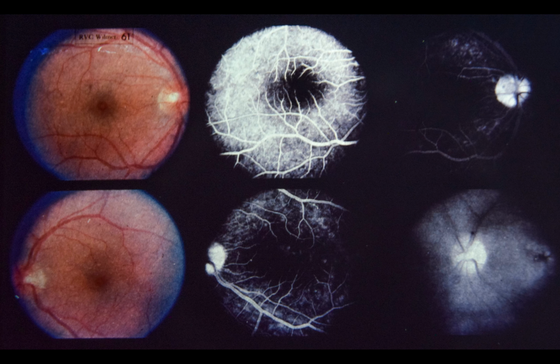He was first examined by us in May 1976, at which time visual acuity was 20/15 in each eye. Media were clear, and fundi, including pars plana, were entirely normal by indirect ophthalmoscopy. With fundus biomicroscopy using a contact lens, there was minimal edema in the macula of each eye, but no cystoid pattern was appreciated. Color photographs of the right and left macula are seen upper left and lower left respectively.